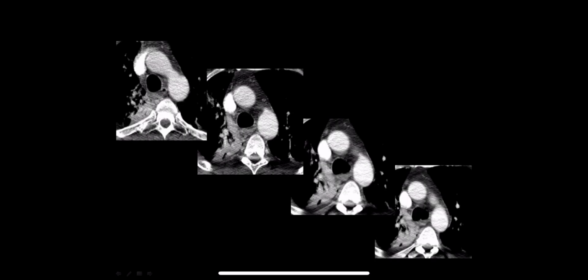Several CT images, so that we see the apparent mediastinal widening is actually due to right lower lobe and right upper lobe atelectasis. This is the top of the pulmonary artery. And then what is this focal outpouching of the proximal descending thoracic aorta? Note that there's no evidence of mediastinal hematoma in this case.